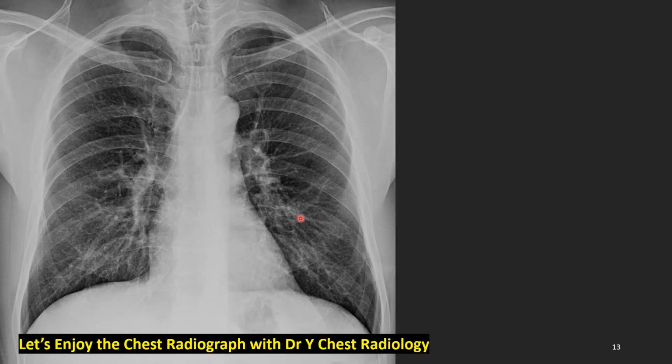Let's see the real case of the prevascular compartment tumors. This young man's chest PA, frontal chest radiograph, does not show anything abnormal, looking normal. Regrettably, we don't have lateral films. Nowadays, most hospitals have a tendency to go directly from PA view to CAT scan.